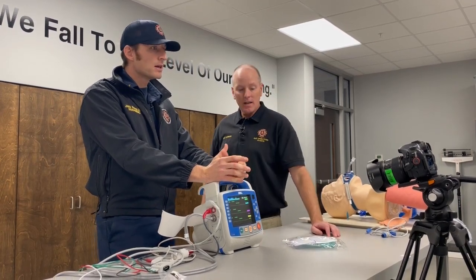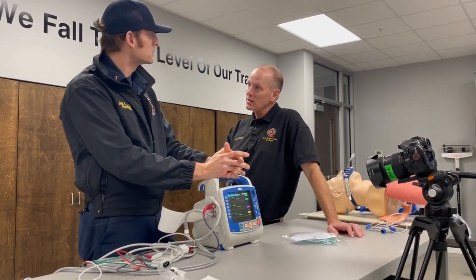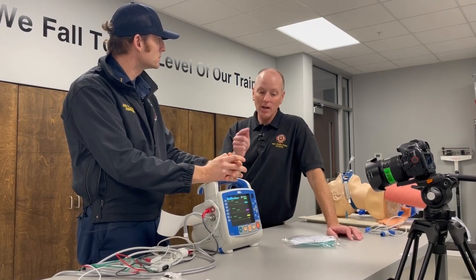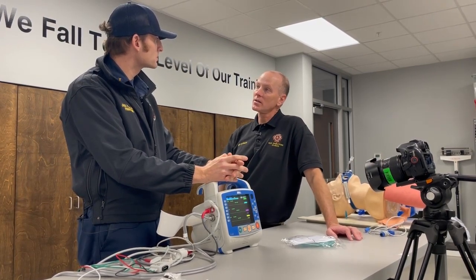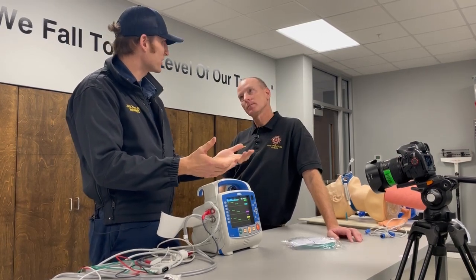35 to 45, right? And that's showing on a cellular level, the oxygen is actually being utilized. I always like to say the fire and the smoke. So the CO2 is the smoke, and it will actually show that the oxygen is being utilized on a cellular level. So it's gas exchange, right? Totally. Which in hindsight is realistically perfusion.